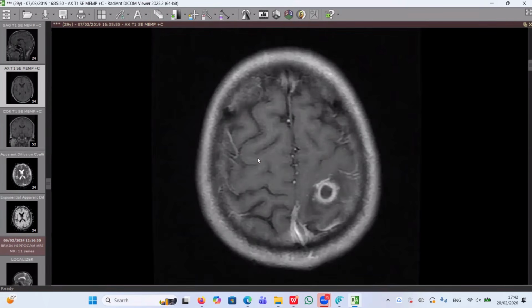Can you give me a differential diagnosis for ring enhancing lesions? Maybe it's an abscess with central diffusion restriction. Maybe it's metastasis, glioblastoma multiforme, glioma. I will differentiate between metastasis and glioblastoma by MRI spectroscopy. The incomplete ring enhancing ones could be MS, tuberculoma, or maybe neurocysticercosis. Very nice.